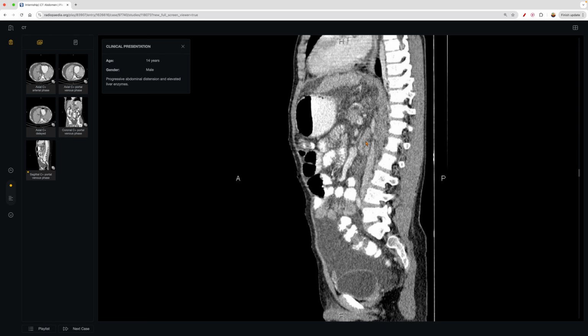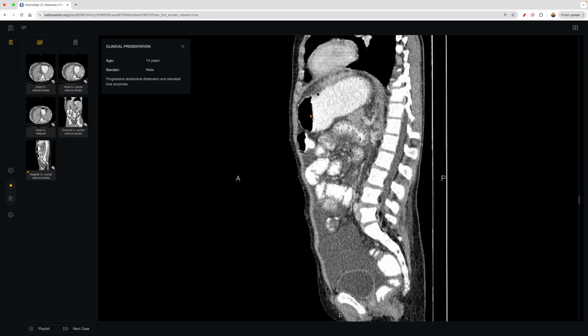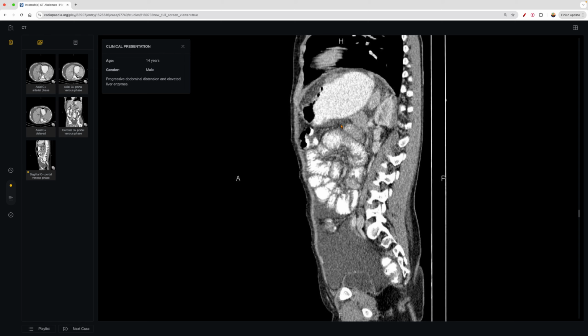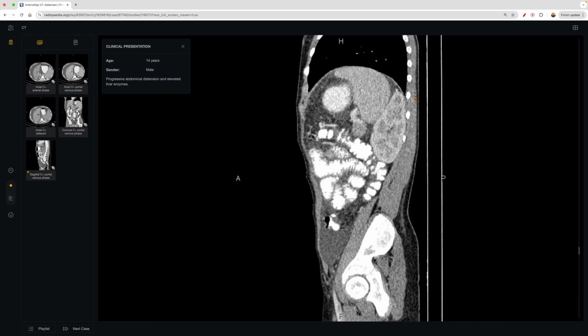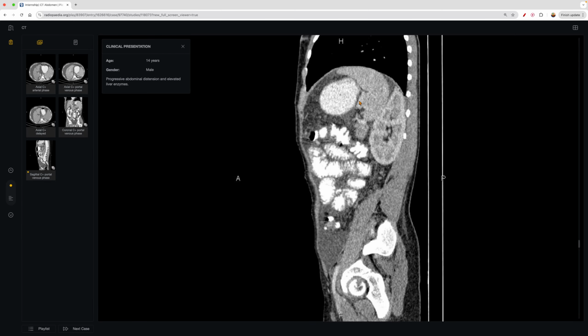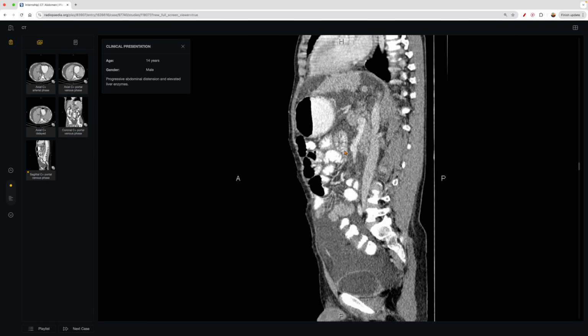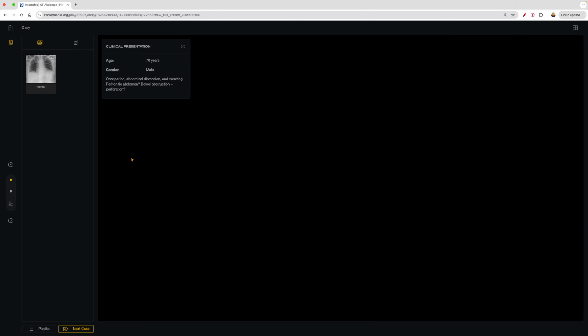Looking at a sagittal, again, sometimes you may see abdominal distension, right? You want to use all the context clues that you can. So there's abdominal distension, see anything else with their spine in terms of positioning or the liver here, and then go from there. So that's cirrhosis. That's very common, of course, to see within the hospital setting.